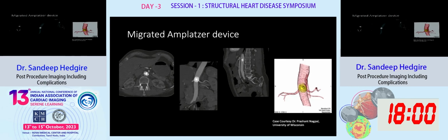Here is a patient who's a 68-year-old female who had a patent foramen ovale and had a stroke. They decided to close the PFO by placing an occluder device.